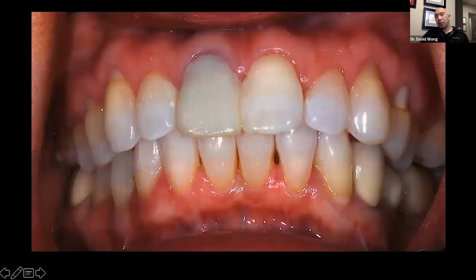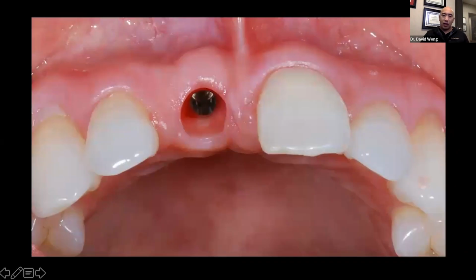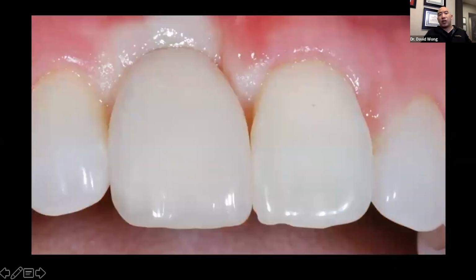So another case, I'm going to walk you through this. A lot of times, you guys, I'll see these types of cases as well, where the implant's placed in a beautiful position, great position here, but you'll notice a skinny little healing abutment on it. And then the next picture that I'll see usually is with it off, and you'll see that the tissue looks beautiful, it's healthy, but the problem is it's all collapsed in. It's not very big. It's the improper emergence for a central incisor.